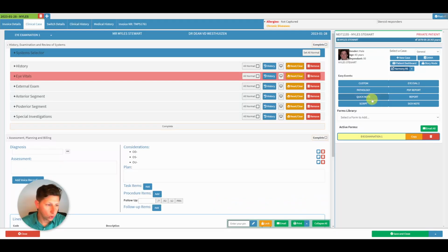I just wanted to show you a feature that is also quite useful. Clicking on this button will take you to Harmony like we just saw, but there is a drop down menu that allows you to look at other ways. So you can look at the archive view of the images. The image view is what we looked at, but you can add additional information.